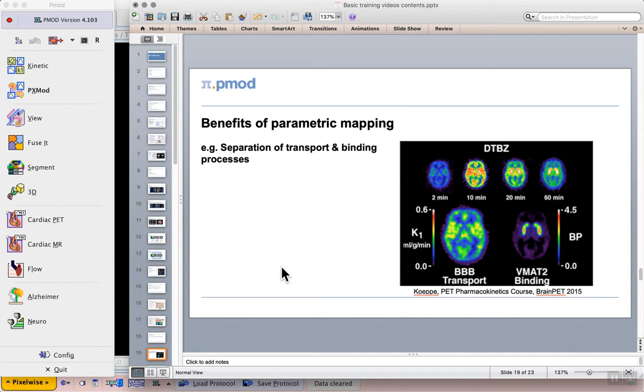Beyond interesting image presentation, parametric mapping allows image-wise averaging and subtraction within groups or for longitudinal measurements for single subjects. This allows clear visualization of treatment or pathology effects and can support statistical parametric mapping, in other words voxel-wise statistics in the same style as functional MRI.